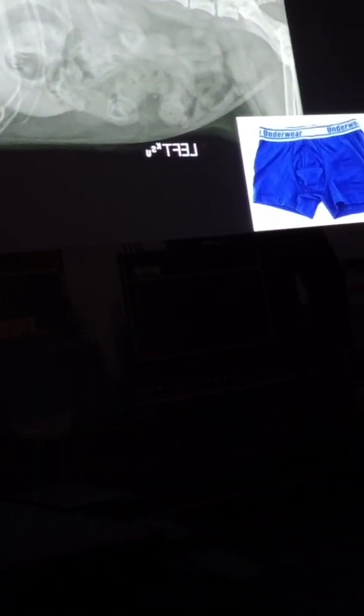Our standard poodle has, but not hers. Great example. So, teaching: left lateral, this view is very important. Use the gas, the pylorus as contrast, and look at the pattern of the material. In this case, look at the margin of the small intestine. Is it smooth, or in this case, is it plicated?